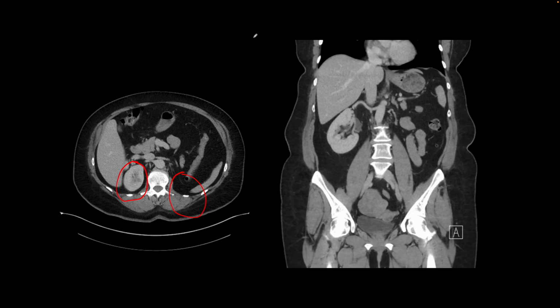And so how to differentiate between the two? When the kidney has been removed, you would find post-surgical changes, clips, stuff like that. And you would find that the origin of the renal artery is preserved and it has been clipped right there near the origin, but you will find the origin. But here, since the origin is not seen and there are no post-surgical changes in the left renal fossa, this is not a case of prior left nephrectomy. This is a case of renal agenesis.